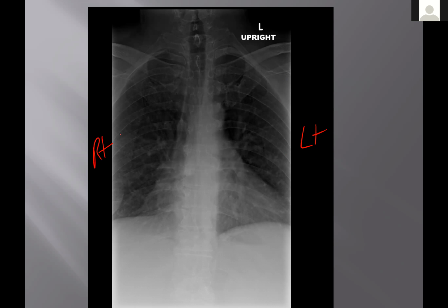Right. Oh, okay, so are you looking right in here? Yeah. Okay. All right, so what we have here is that's the diaphragm. We just got a little bit sharper cutoff than usual of the lower lobe of the lung. This does look a little blunted here because there's cardiac fat that makes it look funny. The cardiac fat almost makes this look like we've got a fluid level. So that's a normal variant. That's not the main finding, but it's actually a good pickup.